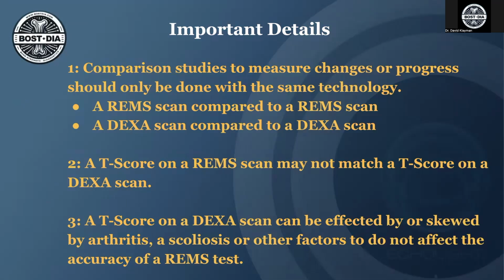As you go through a REMS report, one of the most important things that I remind my patients is that when you're comparing REMS scores, meaning this year versus next year, or if you're comparing where you are now versus a year ago, you want to stick with the same technology, the same type of data. You want to compare a REMS scan report to a prior REMS scan report to accurately measure what changes are going on in your bone health. If you had a DEXA scan, you would compare that to a DEXA scan. You do not want to compare a DEXA scan to a REMS scan when you're measuring progress.